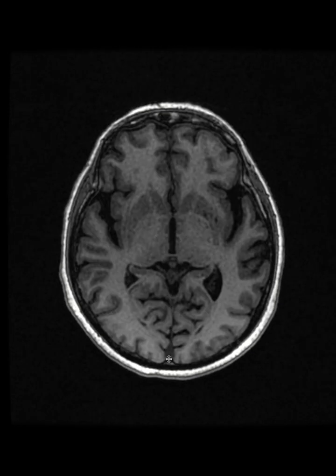So these are basic MRI sequences. We can have different reformats, and these are the actual sequences, but usually institutions do sagittal and coronal as well to get more information. So these are very basic sequences. I'm going to show you in future videos some more advanced MRI sequences like perfusion or ASL.